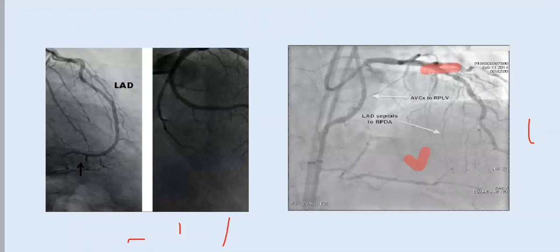Okay. Is the culprit the circ? Why do I have extensive anterior? هو في الحالات ممكن دي يكون ايوه يكون involving an inferior wall. Yes, exactly. So here we have 2 scenarios. One is we have a large LAD wrapping around the apex, supplying the inferior wall.